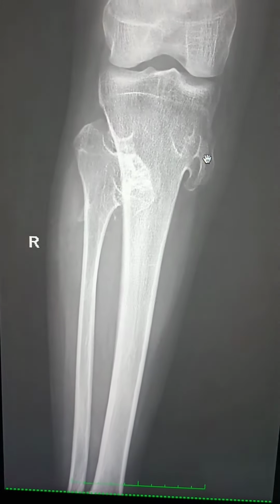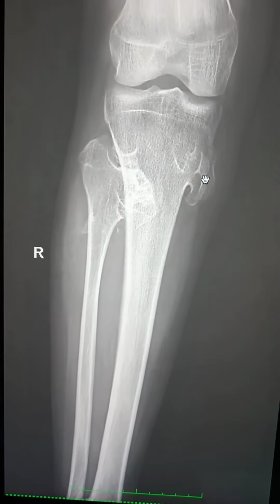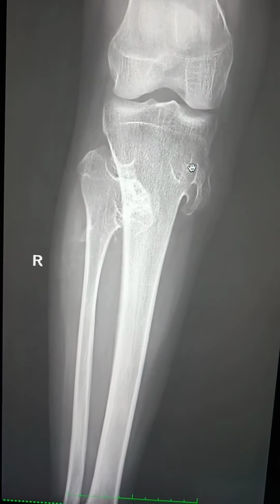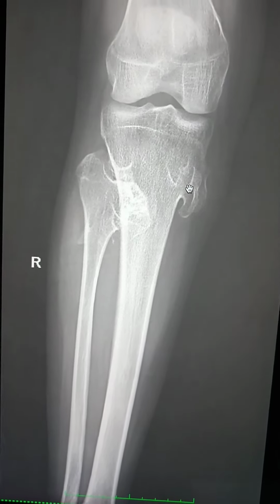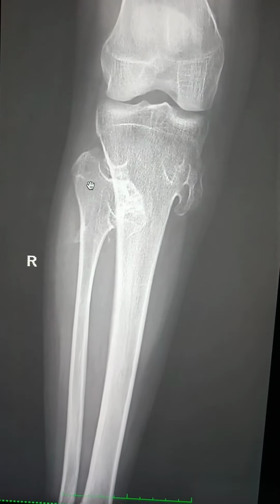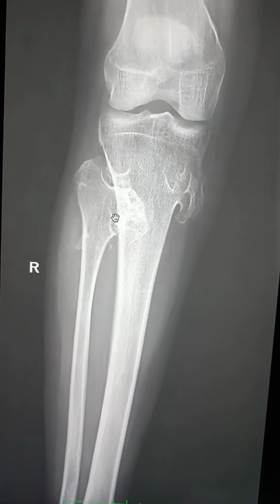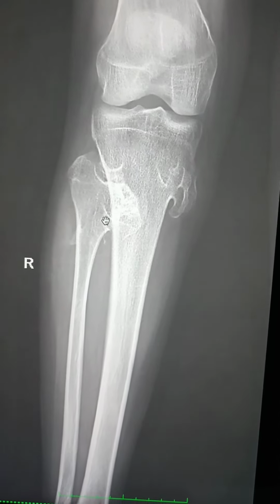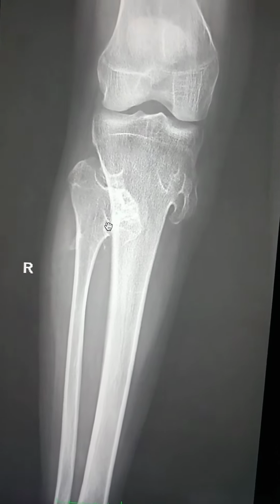Here there is evidence of a pedunculated lesion at the medial aspect of the proximal part of the right tibia, measuring approximately 4.2 by 3.2 centimeters from the cortex. This pedunculated structure, which is continuing with the parent bone, is suggestive of exostosis. Also, there is another sessile bony growth on the medial aspect of the proximal part of the right fibula, measuring approximately 3.8 by 2.4 centimeters from the cortex, which is continuing with the parent bone. This is suggestive of exostosis.